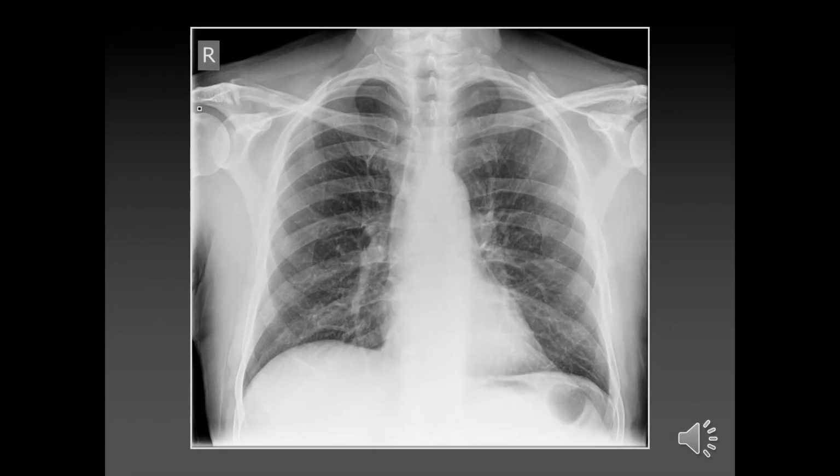So, anyone want to have a shot at interpreting this one? Who's a fourth year here? Alright, Sana, you're going to have to do this one. Start from the top. What type of X-ray is it? Yeah, fantastic. Is it rotated? Yeah. Is it adequately inspired? Yeah, so that's bang on 6. P, is it penetrated properly? Yeah. And is it exposed? Well, it is.